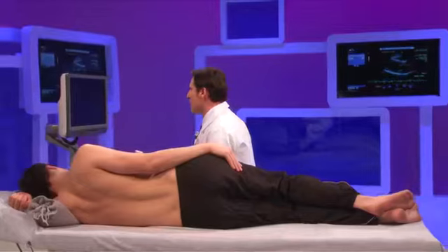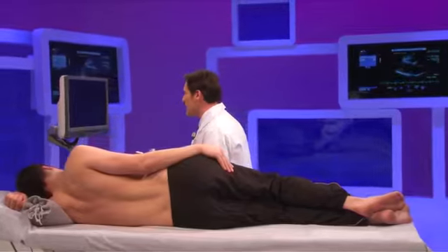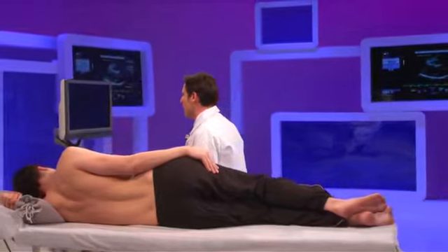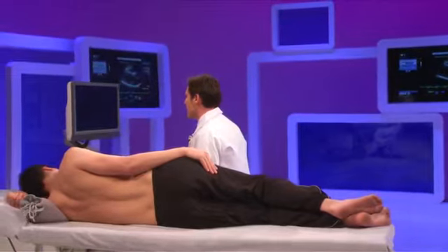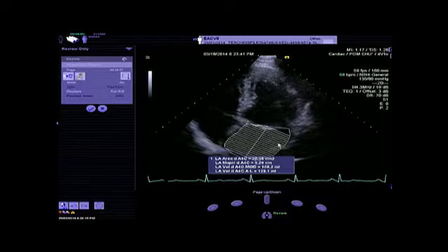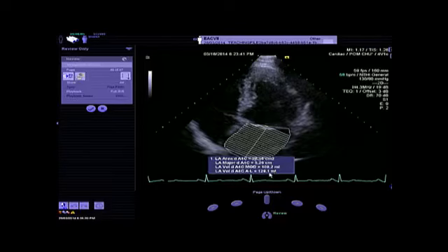So now let me move to the last part of this presentation regarding the consequences of the mitral regurgitation on the left atrium. And here we can have the measurement of the left atrium volume using again the Simpson method. We have a volume more than 128 milliliter, and we should index this value for sure in these patients. And when we calculate, the indexed value is greater than 40 milliliter per meter square.